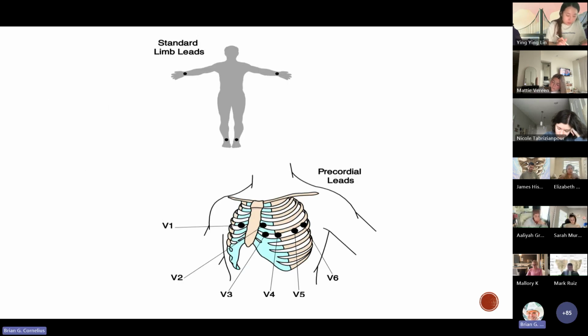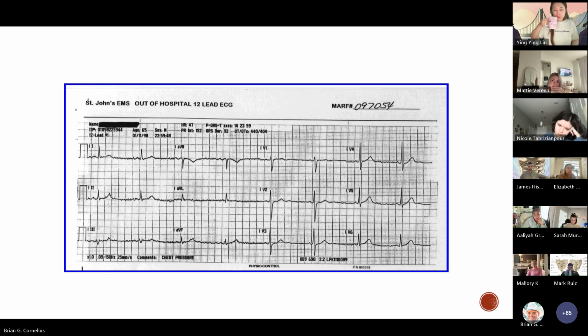And this is just a picture illustrating what I was talking about there. So ways you might see this deployed, you might get a picture and it says, which 12 lead viewpoint is this? All right, so now we're going to take a look at a traditional 12 lead.